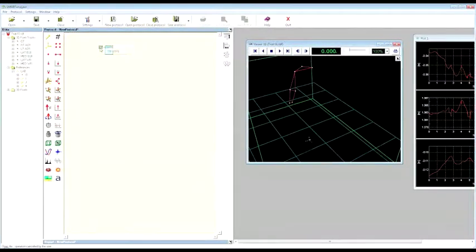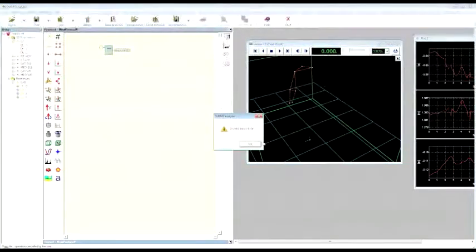Otherwise, if you drag and drop an input that is not correct, as you can see in this case, the dot will become gray. And so that means that the input that you are going to use is not a correct input for that operator. Okay. And at the end, if you try to drop it, you will have this error message that reminds you that it is an invalid input data.